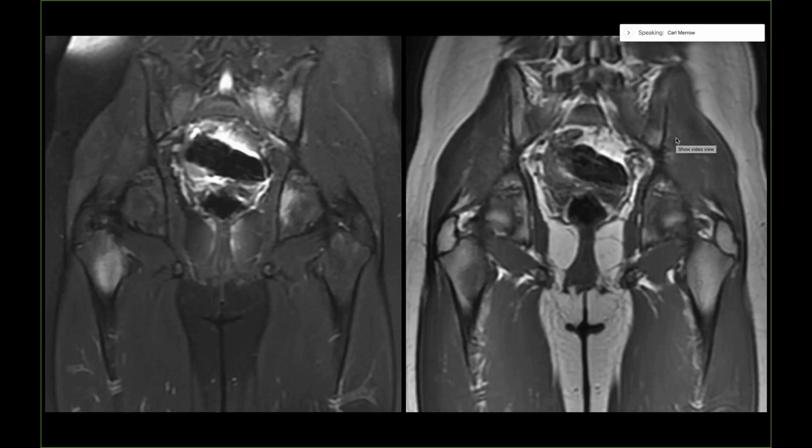I didn't really think it's a good look for pyogenic osteomyelitis because there's no soft tissue abnormality. It's so multifocal, and the kid was otherwise pretty well despite having these fevers. So the rheumatologist came down to discuss the case and said, kids with chronic recurrent multifocal osteomyelitis don't typically have high fevers like this. That's true. And I was like, okay, so sort of take a step back.